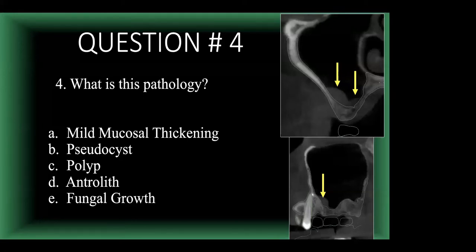So Robert, put the question up. Please pick A, B, C, D, or E. And our answer is A. Very good. Mucosal thickening. So let's see why that is mucosal thickening and the other answers are not correct.